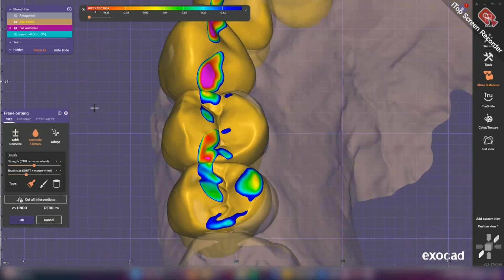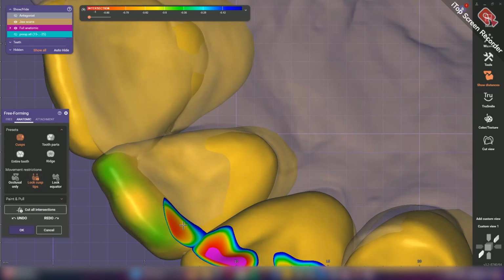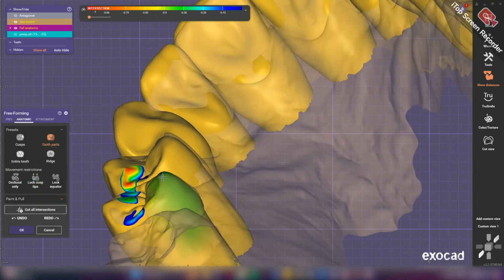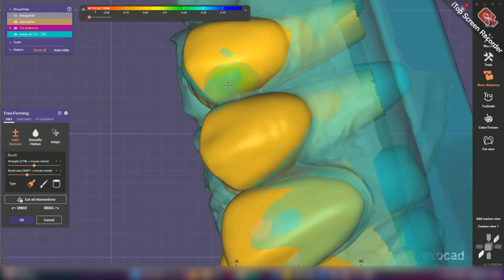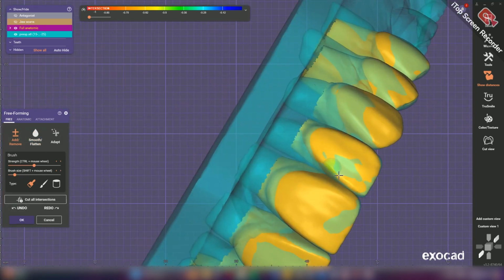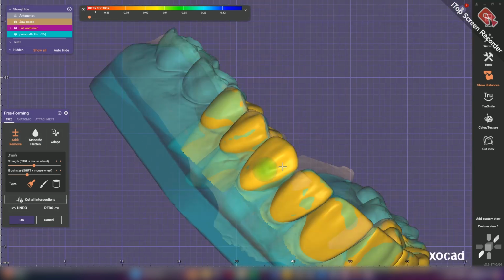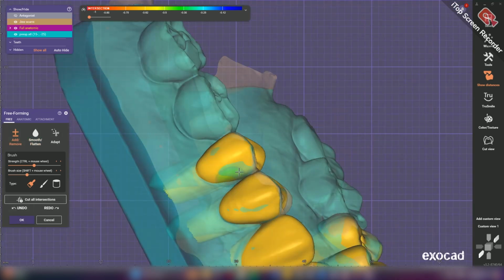Freeform mode is where the magic happens. This is your chance to unleash your inner artist, refine the tooth shapes, smooth surfaces, and add details like ridges and cusps. Consider the size of the existing teeth and the pre-op design. This gives you a good starting point for what feels comfortable and functional for the patient. Pay close attention to occlusion. Those teeth need to fit together perfectly.